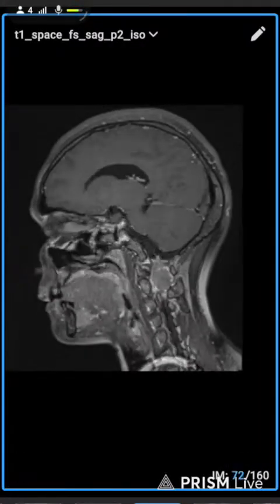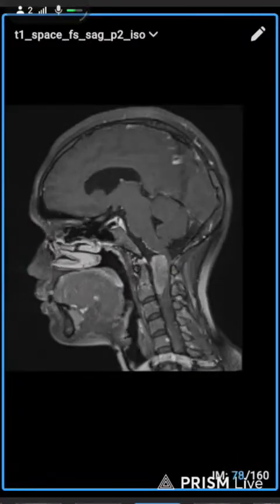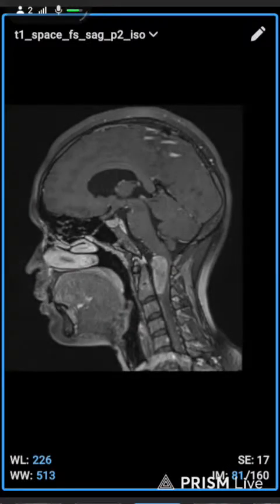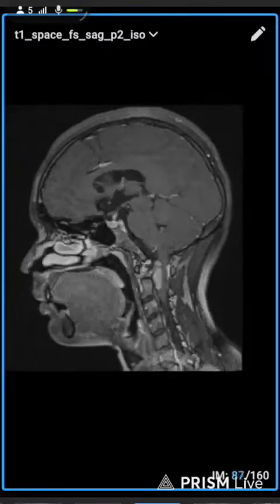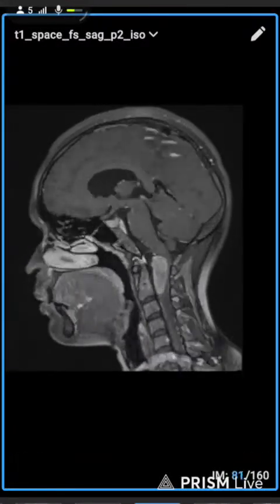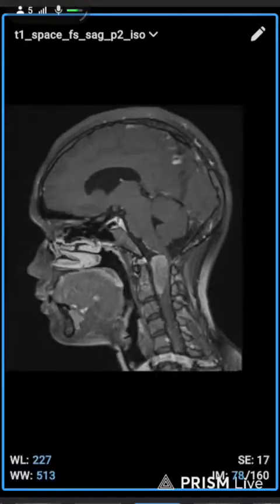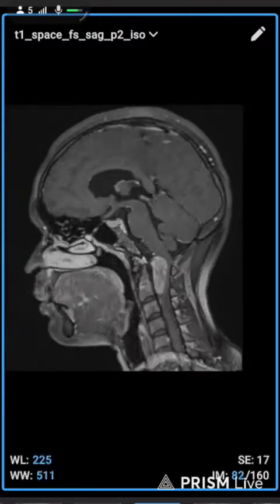It's a more critical tumor in the cervical spine. The tumor was compressing the spinal cord so that the patient is unable to move the limb, or a paralysis situation happens for this type of tumor, just because it compresses the nerves that control everything in our body. So that type of tumor is more severe.